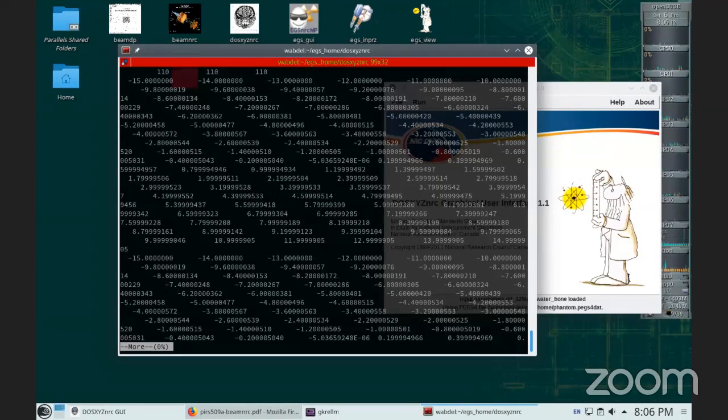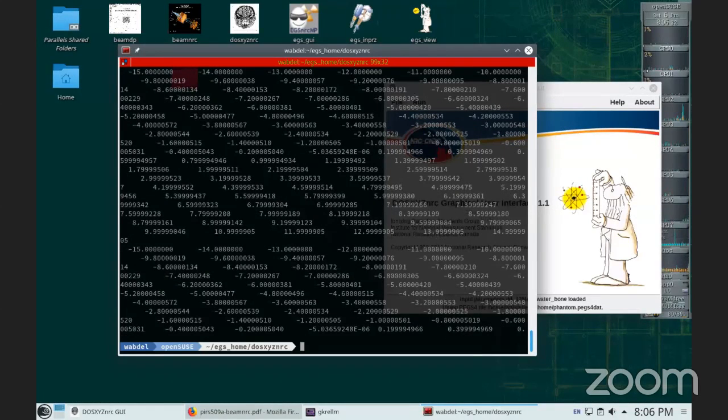Okay. So if someone knows or can write code for us that makes sense of these numbers, I would be very happy. You can actually contribute it to the guys from NRC, and they will really appreciate it. Although they have done it in a different way. That's why people have used the stat dose and the dose XYZ applications.